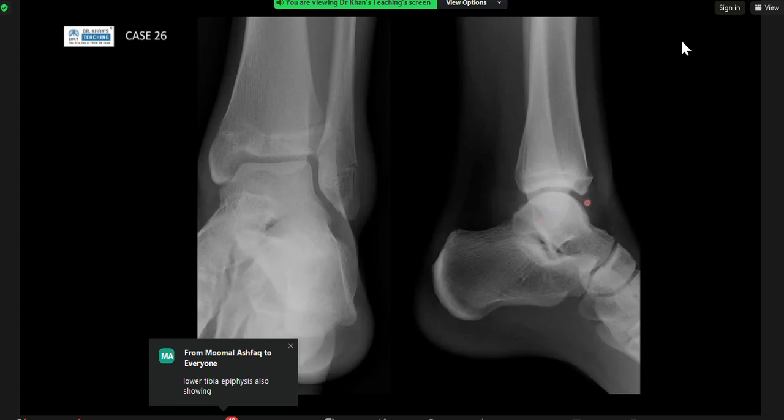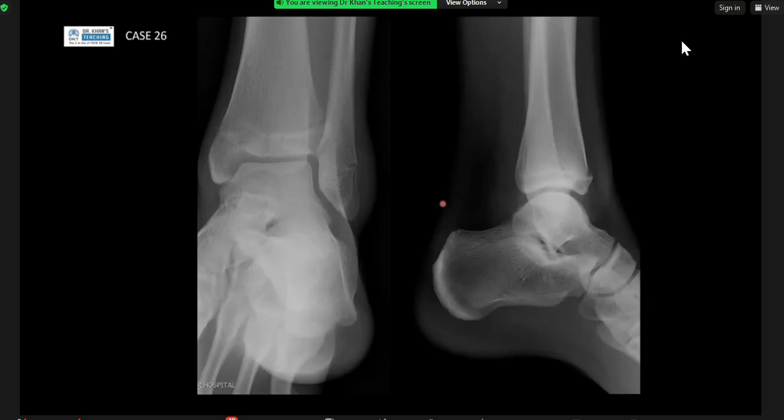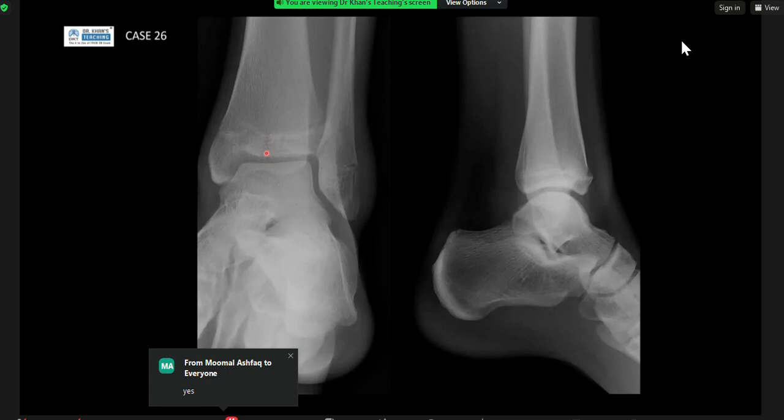And then when you're looking at that, you're thinking of any intra-articular processes going on. It's trauma, so I won't be thinking of JIA. But if you look again closely, you're drawing contours. If you come down the metaphyses and suddenly you've got a little step here, okay? And then you wonder, yes, I know physis can be irregular in the distal tibia, but I just wonder if there was just a little bit odd in the front bit here. And then if I take a look again, thinking, okay, is this a fracture? There is a lucency that's just behind this at the tibial epiphysis.